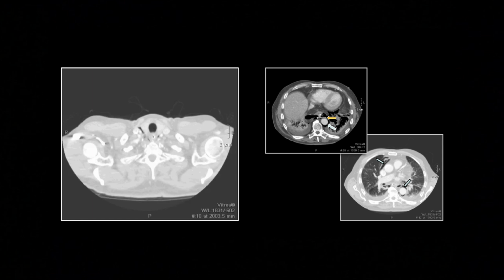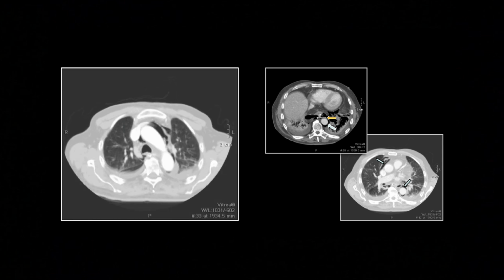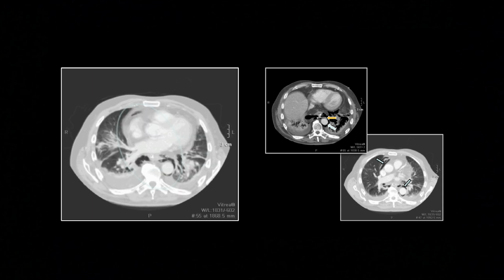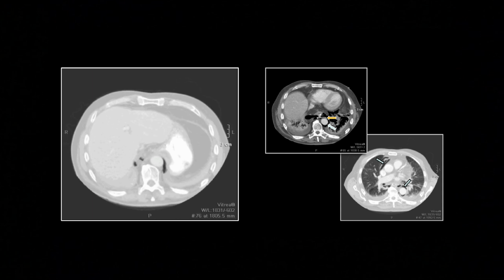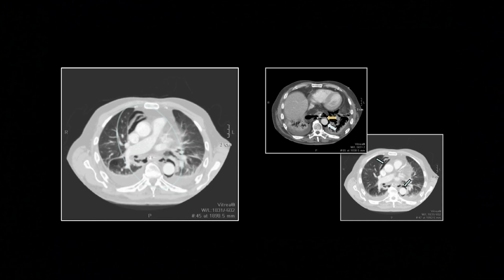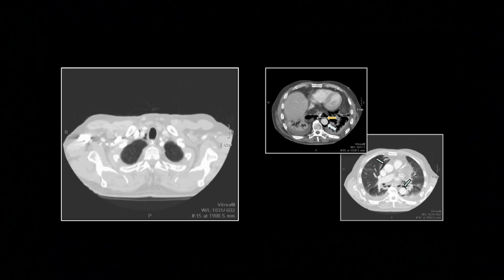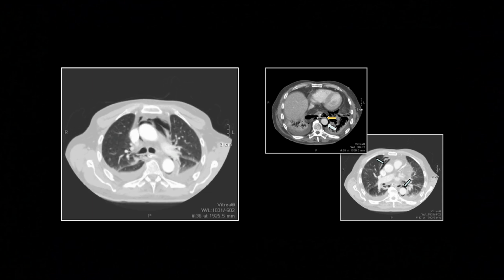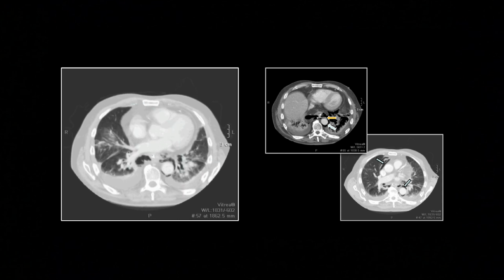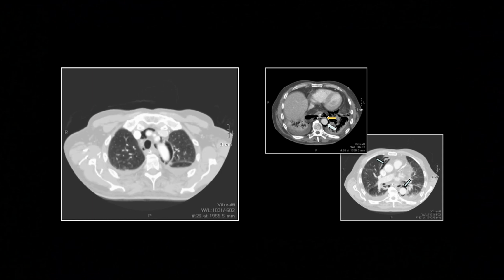Oh, sorry, I was going to give you the lung window on that as well, and you can see the extent of mediastinal gas. The interesting thing is that with Boerhaave syndrome, it's not such a rapid rupture, and so the pneumomediastinum tends to infiltrate all throughout the mediastinum. And that's in contrast to a traumatic esophageal rupture.